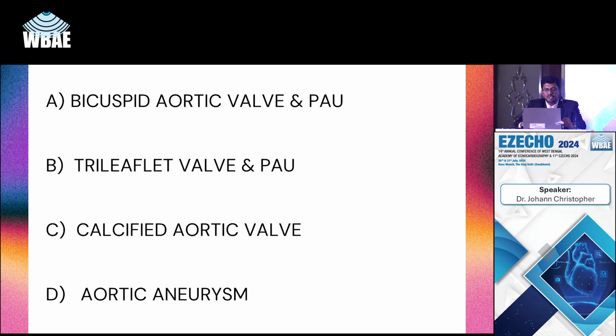This is cine image. This would be exactly what you would see on the echo. So there's nothing different on MR. We see the same things.